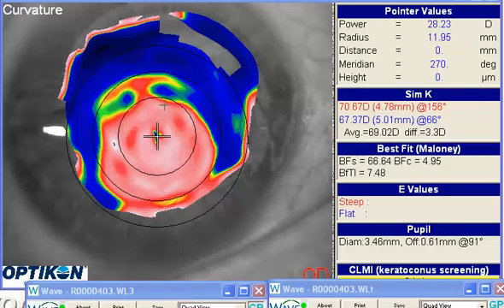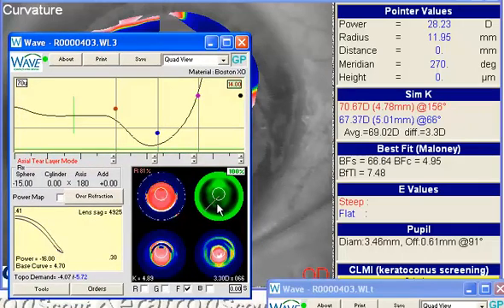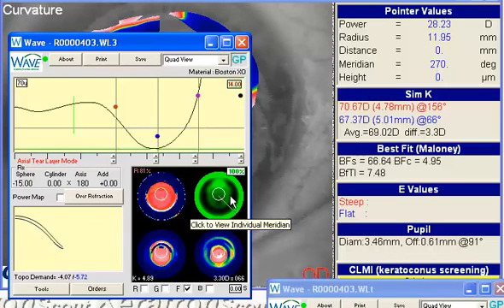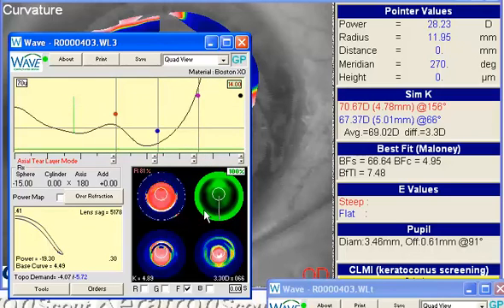And then what I would also probably try to do, we got a lot of data in through here, so I'd probably really try to match this area very closely, and then hopefully we can map out from there afterward. So if we look at your designs, based on the data that you have to work with, these actually look pretty good. You've got some edge lift over here that's probably causing, in this area up here, some of those problems that you have out on the edge of the lens. So I'd like to see if we can get that to line up a little bit closer.